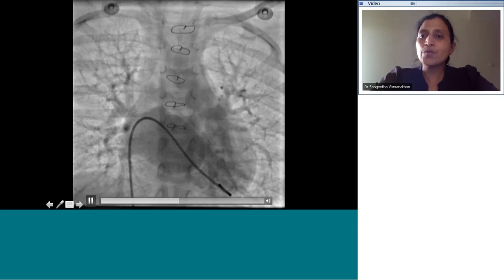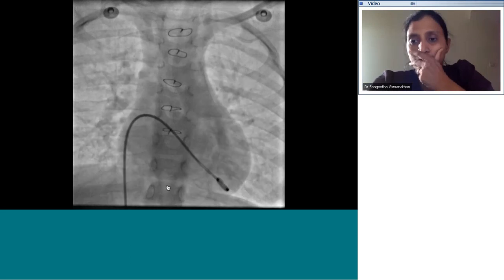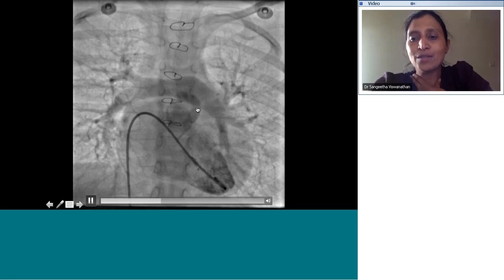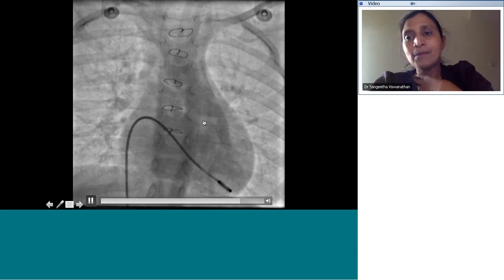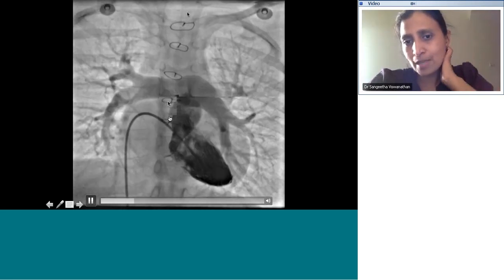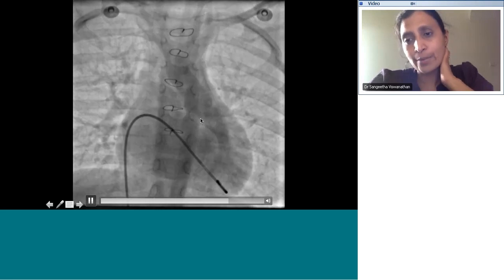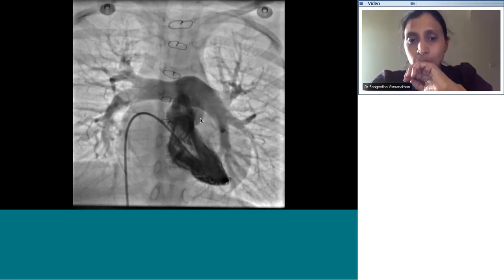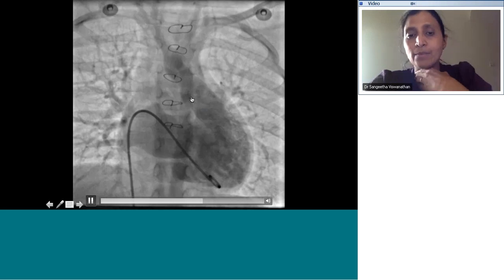Is there anything you specifically notice about the pulmonary arteries? So although CCTGA is correct, it's not a complete diagnosis. Anything else you notice about the pulmonary arteries? Maybe better viewed in a lateral projection, but even here, you can see this patient has had surgery, right? So what procedure do you think this patient has probably had? What can you see here in the pulmonary artery?